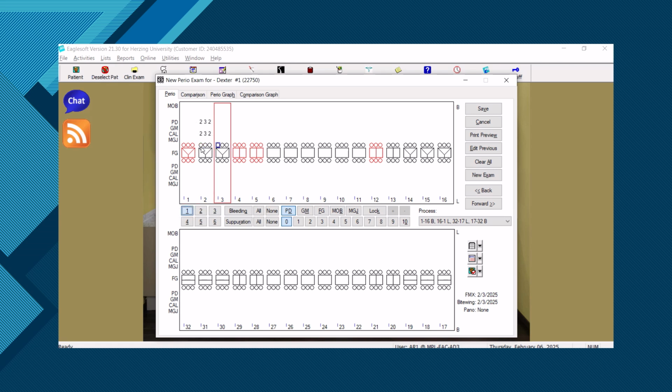So, can you see how the pocket depth is coming in right here? And the clinical attachment level is automatically being calculated. Also note that the readings 1 to 3 are considered normal and healthy, and those numbers will always be in black. Anything 4 and above will be documented in red because that's going to indicate that there's probably some inflammation or some disease that's probably forming in that area. So I'll show you what that looks like.